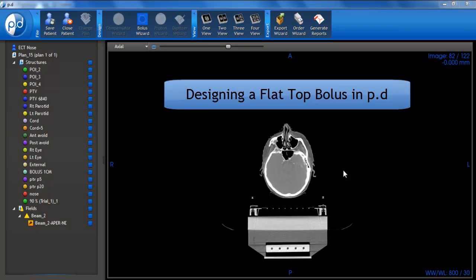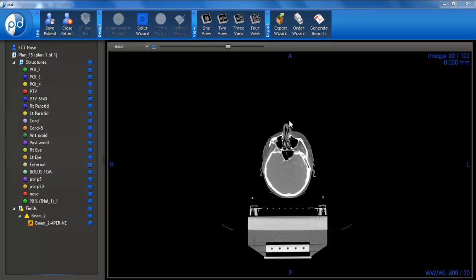Welcome to our PD training video on flat top bolus construction. So as you can see, I've got PD open. I've got my patient loaded up. This video tutorial utilizes the ECT nose case provided by Dot Decimal.